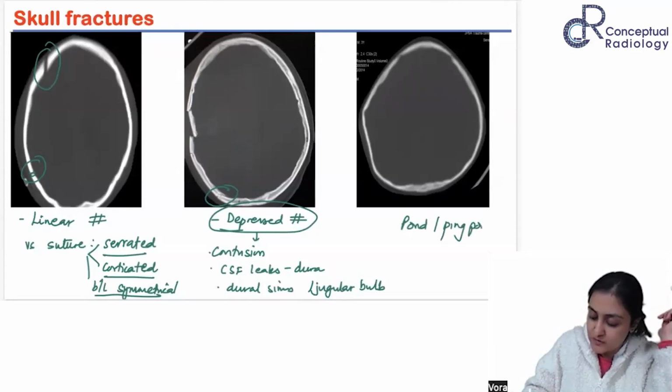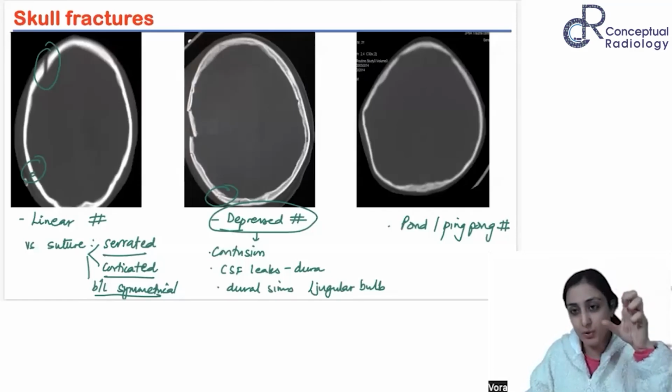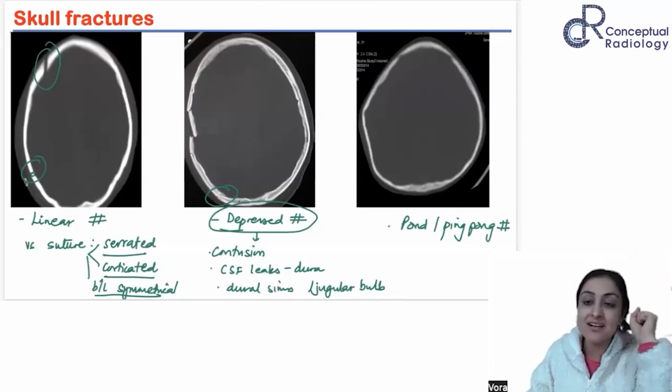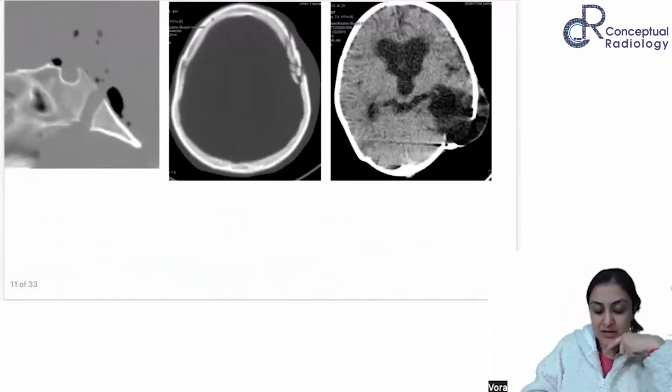And this is also one of the things you get as a spotter. It comes in spotters, it comes in quizzes. So ping pong fracture, pond fracture, where because the baby's bones are very flexible and malleable, they don't break but they get deformed, right? This is what you see usually in infants or young children.